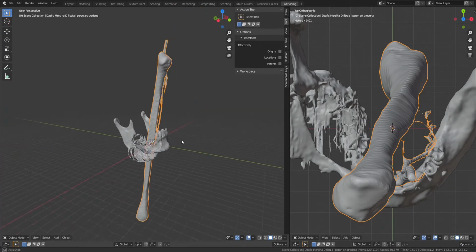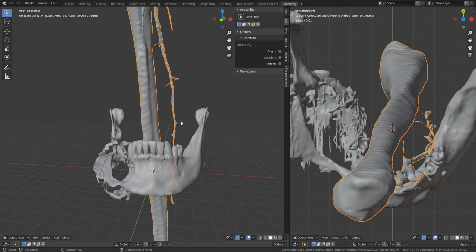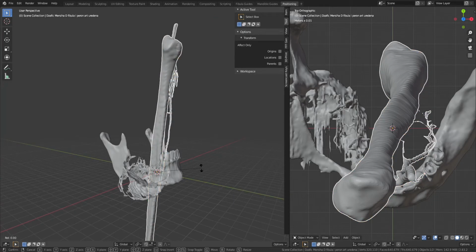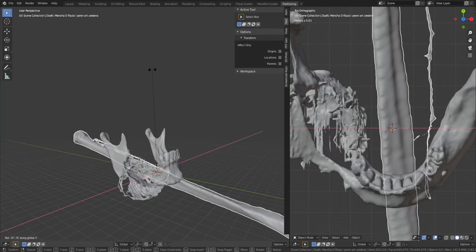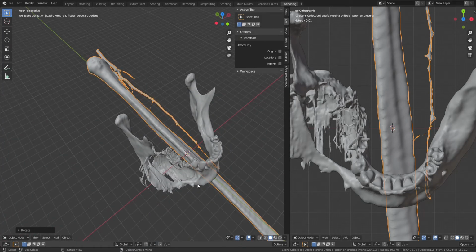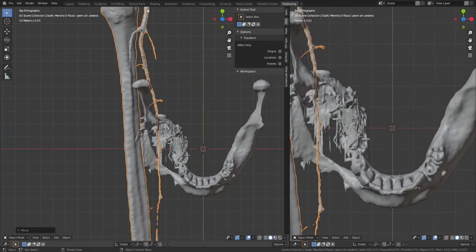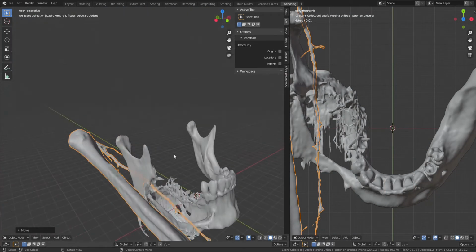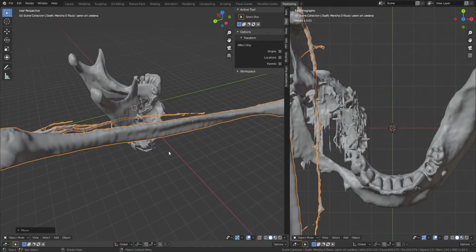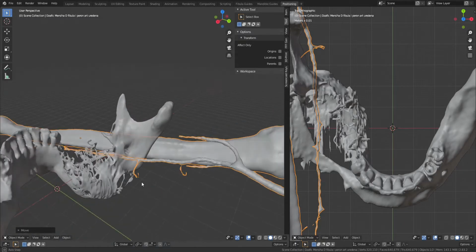I can't use this orientation of the fibula, because the peroneal artery stalk will be somewhere very high, and it would be hard for the surgeons to make the anastomosis with the facial artery and vein.